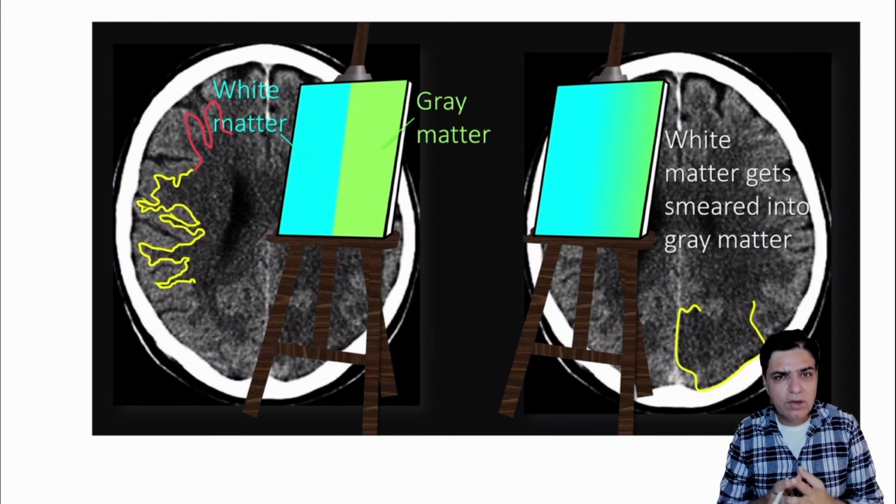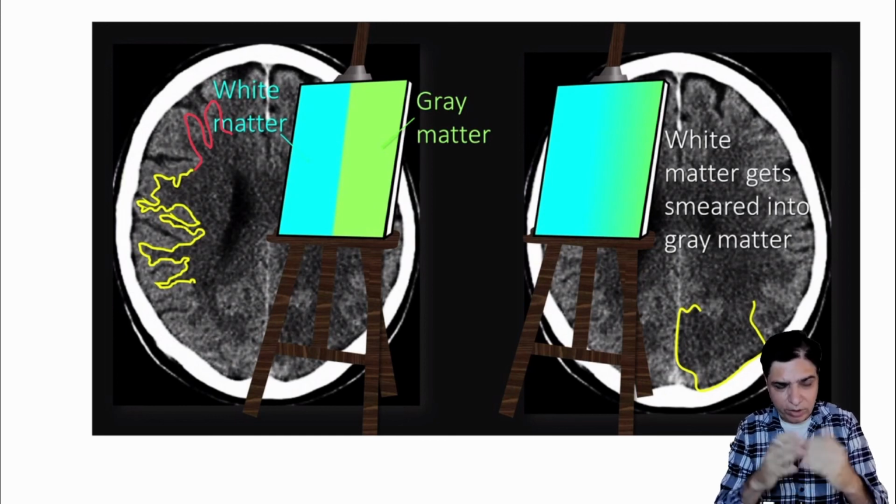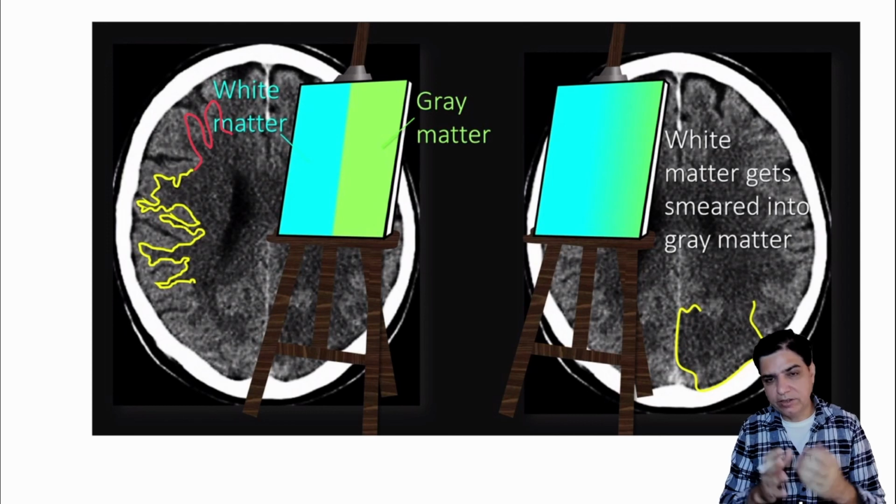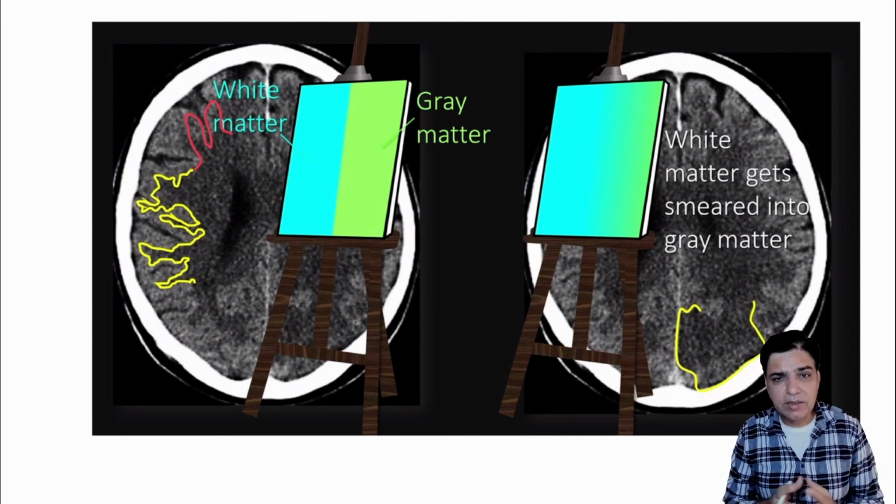I told you fractures are easy to pick up because in that case you will be looking at the whitish bony window, and usually with the 3D reconstruction you can pick it up, especially in pediatric medicine.